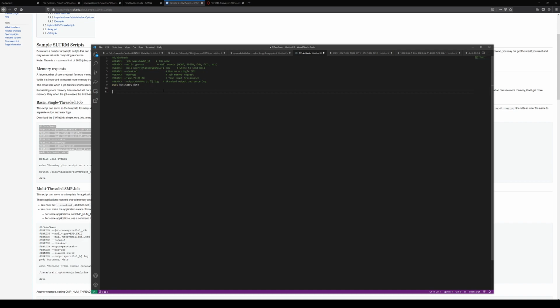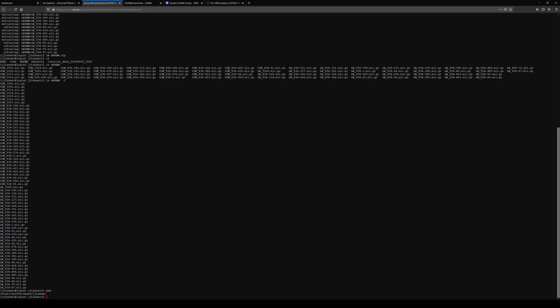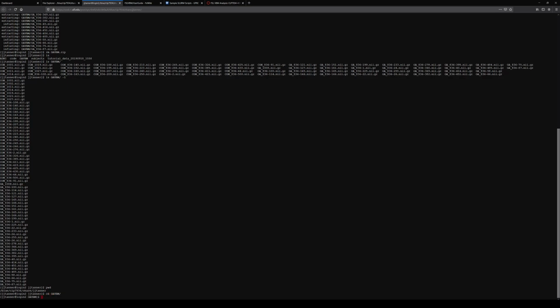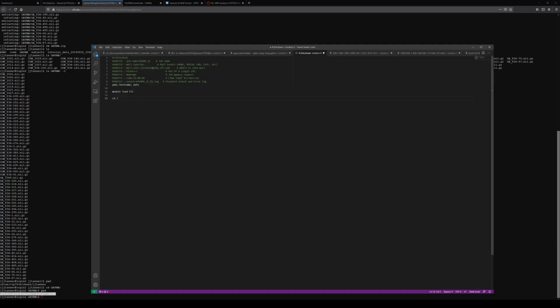So now we need to do a couple things. We need to module load FSL, and then I'm going to go into this directory. So I can copy this from here, and then I'm going to go into the OA VBM directory, and so I will copy this path. So if you're using this online terminal with the on-demand service, if you highlight, it'll automatically copy. So I can come over here and just paste that in.